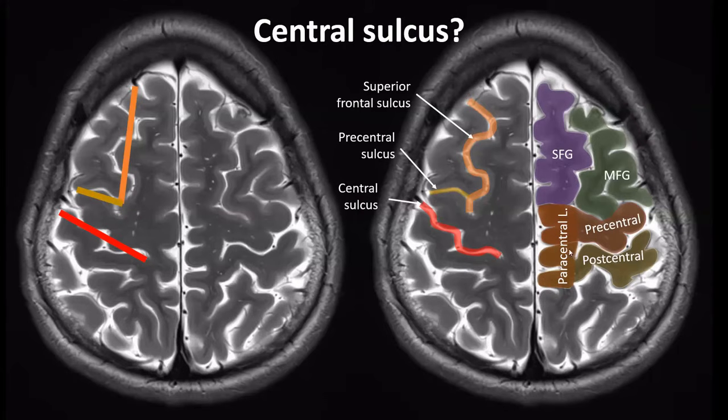So this is the paracentral lobule, where the postcentral and precentral gyrus are continuous with one another and form one functional lobule. Then we have the postcentral sulcus behind the postcentral gyrus. And you remember from our anatomy lesson at the beginning of this presentation that this then has to be the superior parietal lobule.